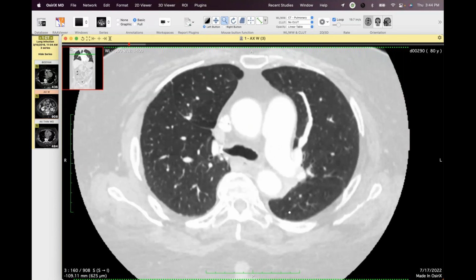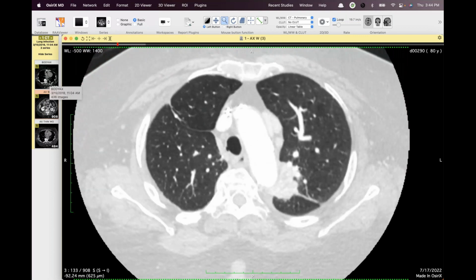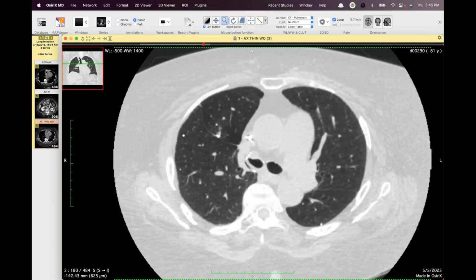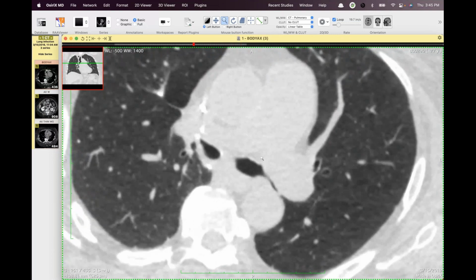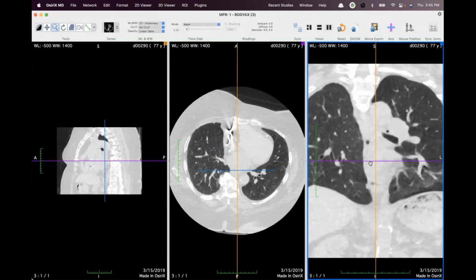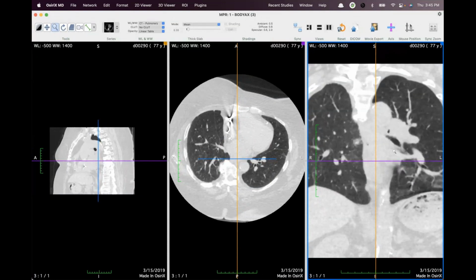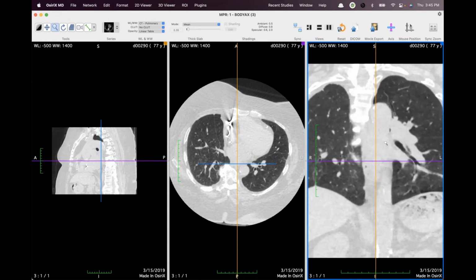So is it really eparterial? It seems to me it's still hyparterial. Please show me how it's on the top of the artery. David, I think that's totally fair. They're just calling it that based on where it passes between. It's going above the pulmonary artery right here, but it kind of comes off proximal to the pulmonary artery and then goes above it.